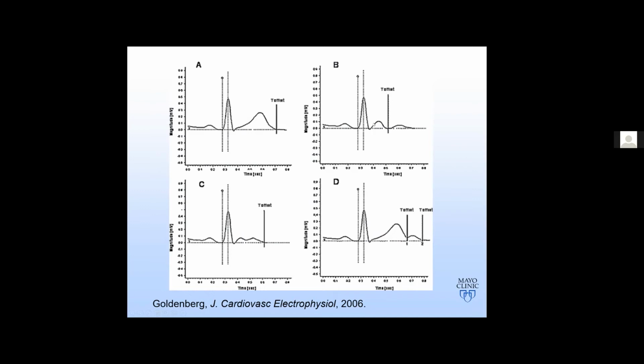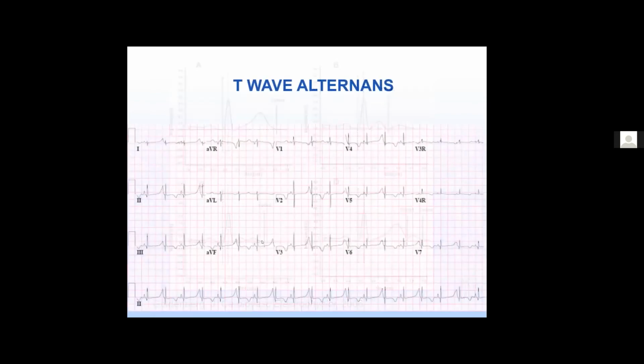So if this T wave comes completely back down to the baseline, and then there's a U wave afterwards, you should not include that U wave in the calculation. If the U wave is more than half the height and it's a contiguous thing, then you should include that in the calculation.